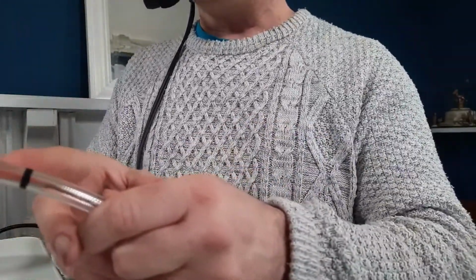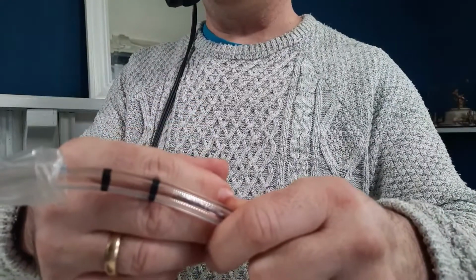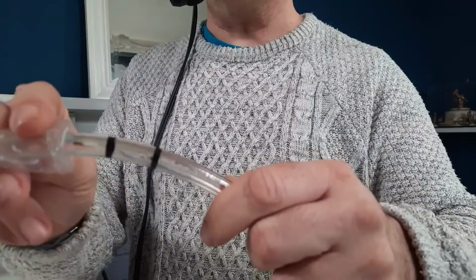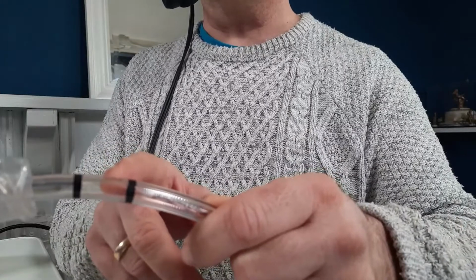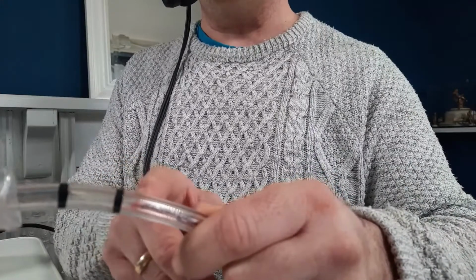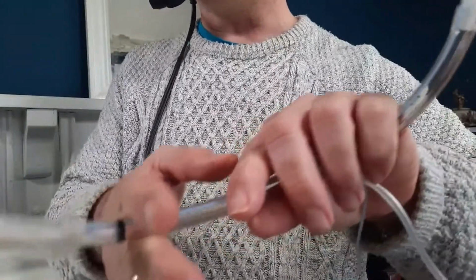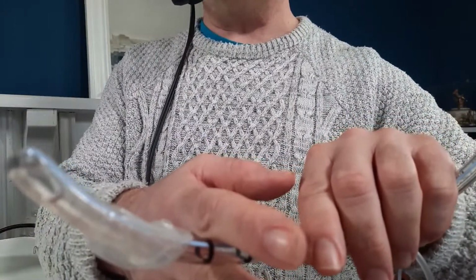The two black marks here are what the intubator is looking for when they are putting that tube into the patient, and you're trying to get the black mark past the vocal cords so that you know that you're in far enough but not too far. So you're getting past that first black mark through those cords, and then you know that you haven't gone too far, and hopefully you should be able to ventilate the patient appropriately.